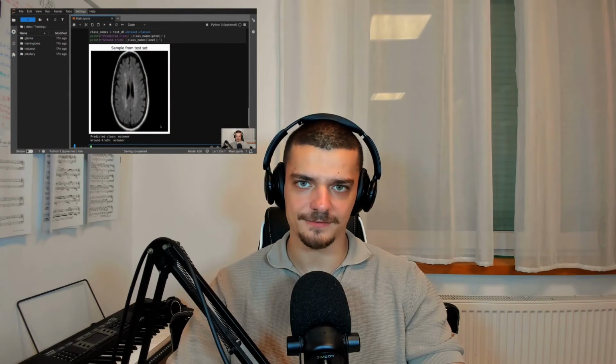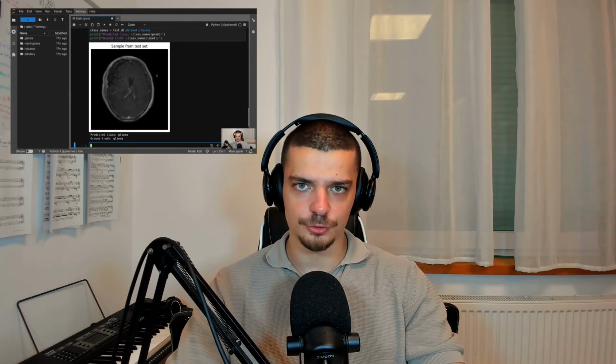Welcome back. In this video today, we're going to train a convolutional neural network built in PyTorch to classify images of brain tumors, or at least scans of brains, and then to classify if there is a tumor, and if yes, what kind of tumor it is. So this is a perfect machine learning project for beginners or intermediate programmers. Let us get right into it.